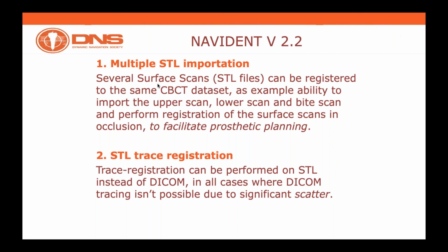Then one of the key features that we're introducing with the new version 2.2 is the opportunity to obtain registration not only with the DICOM dataset, but also by importing and matching the STL file.